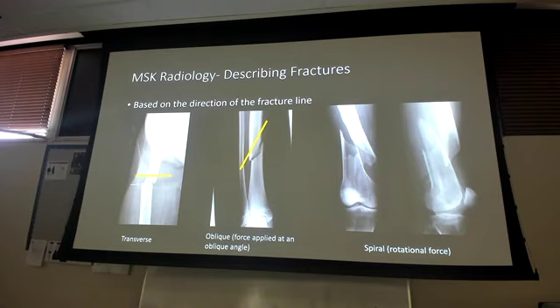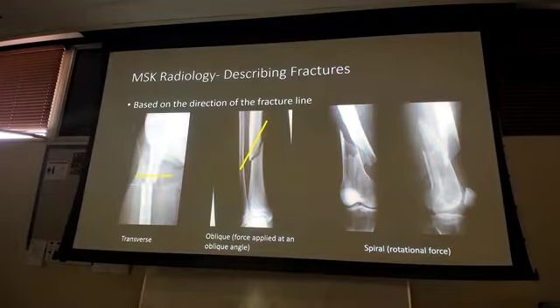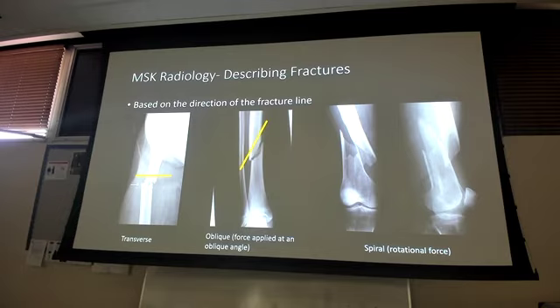Things that were either asked over the weekend or on the break last time, I want to address. Before, we were talking about looking at this hip x-ray and the AP versus the PA. Something I didn't clarify for you guys before is that the majority of x-rays are going to be shot AP. That's just the standard. They'll be shot going anterior to posterior.